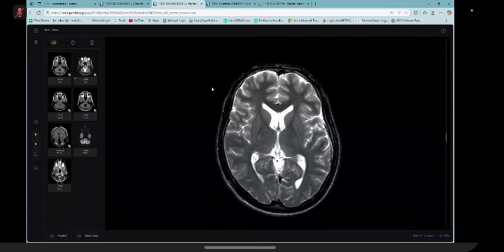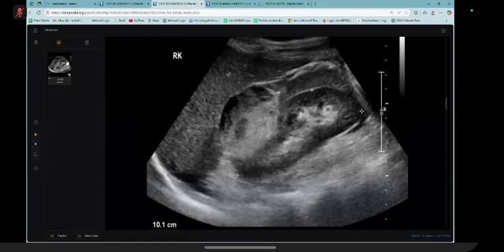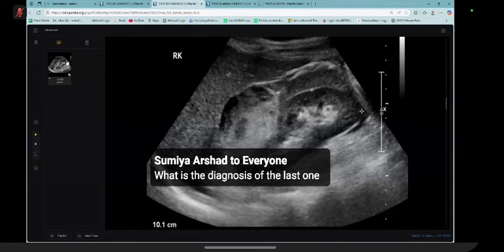Hello, sir. Can you hear me? Yeah, I can. So your next case is within this packet only. Then I will change the packet. Sure, sir. Just go ahead with the next case for you. And first you will get the ultrasound of a 25 year old female, right upper quadrant, acute pain and tenderness.